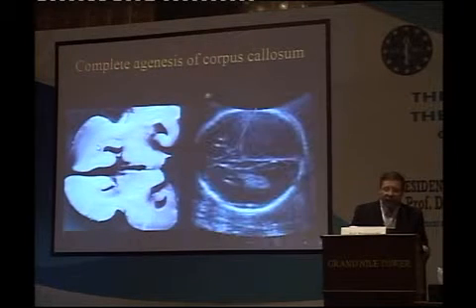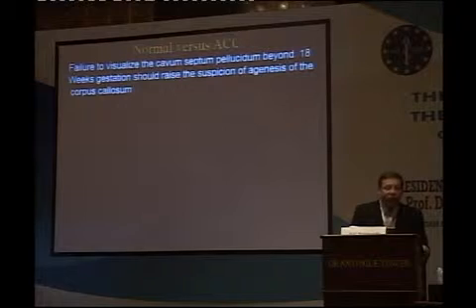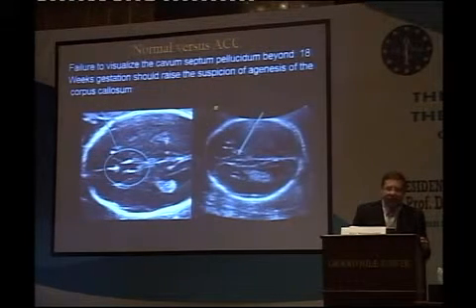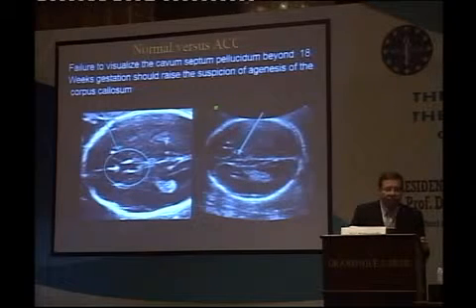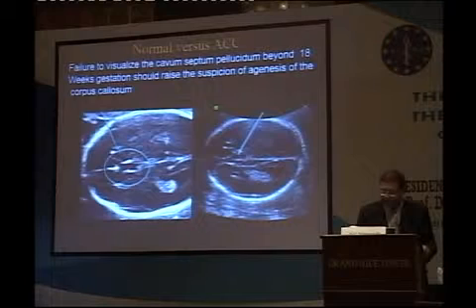In agenesis of the corpus callosum, you cannot see this beyond 18 weeks. So if you do a transaxial view of the fetus, failure to visualize the cavum septum pellucidum beyond 18 weeks of gestation should raise the suspicion of agenesis of the corpus callosum.